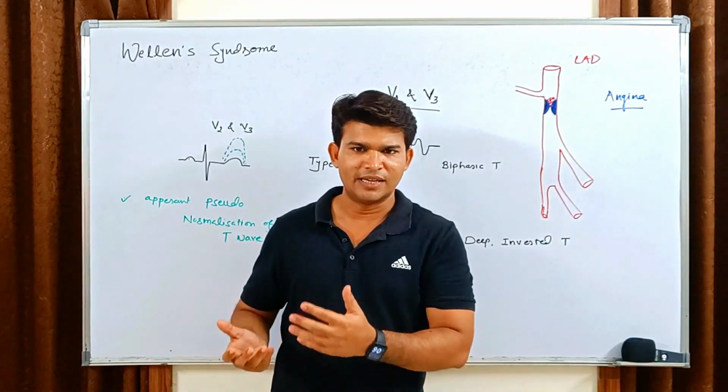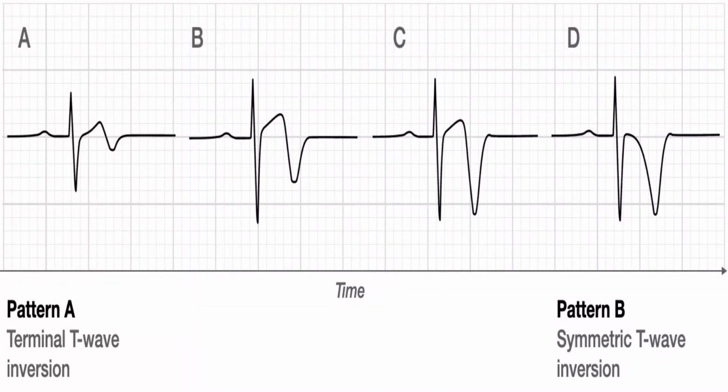Okay, let's discuss ECG. See, we have an ECG with a typical Wellens type A and B pattern. In type A, we have a biphasic T wave. See, this is a biphasic T wave. Here, basically, the ST segment, then this is the T wave, upsloping, then downward. In A, we have a biphasic T wave, that is the Wellens type A pattern.